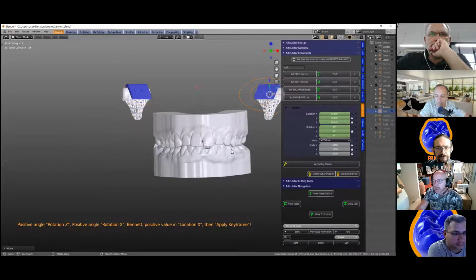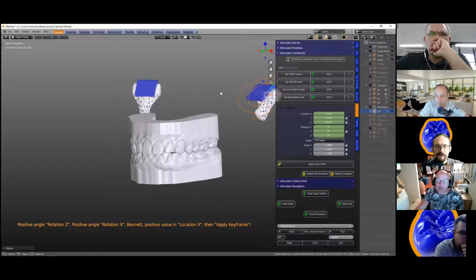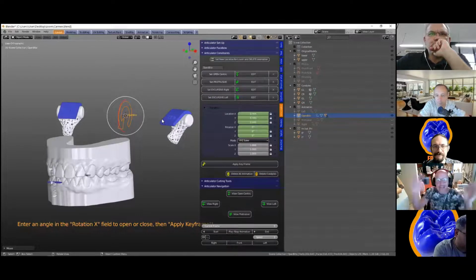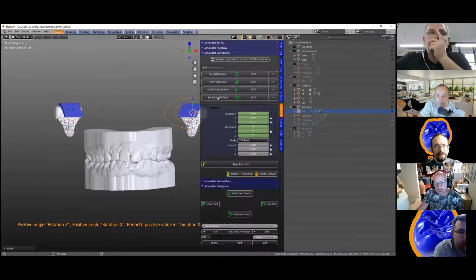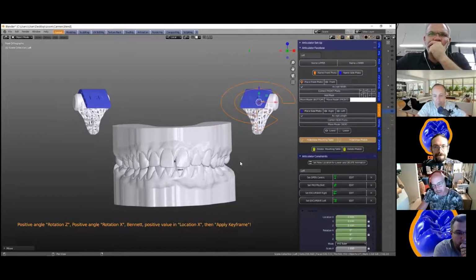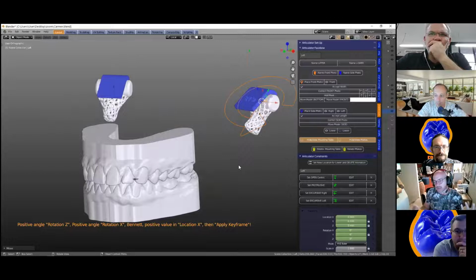The other thing with this update is that in the past, I've been going on TeamViewer sometimes, and some users click this over and over again, and I go in and we've got all of these arrows everywhere. Now this has been solved because, as you see, I can click as many times as I like. It isn't going to change, it stays put. So this is a fantastic fail safe. The other fail safe that I've included is for the mounting table. Some of our users click the mounting table over and over again, and it's inundated with mounting tables. So that's changed. All right, excellent.